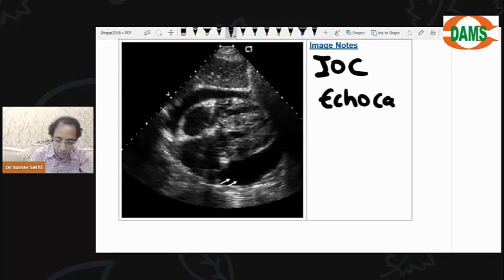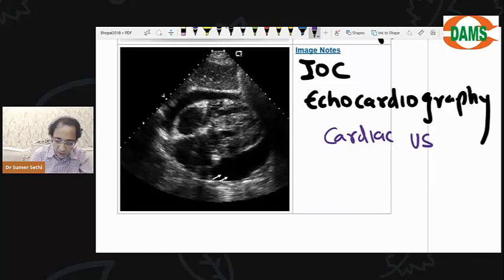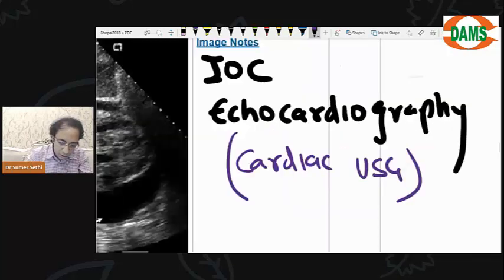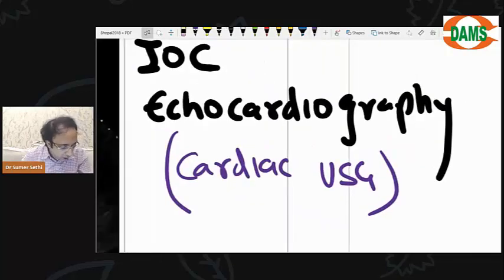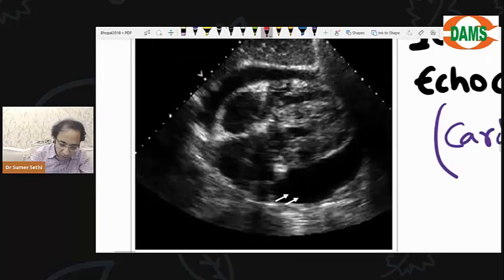Investigation of choice for pericardial effusion is echocardiography. What is echocardiography? Fancy name for cardiac ultrasound. Okay, anybody? What is echocardiography? Fancy name for cardiac ultrasound. Now, how to identify pericardial effusion? Just see with me. एक बार देख लो.